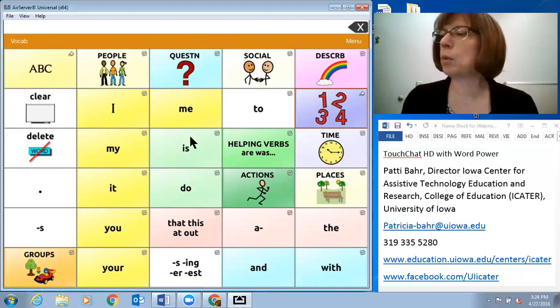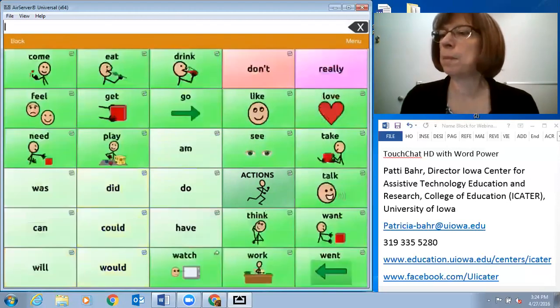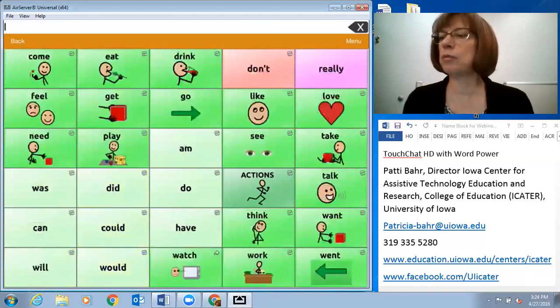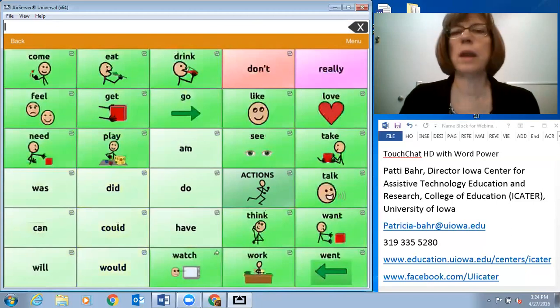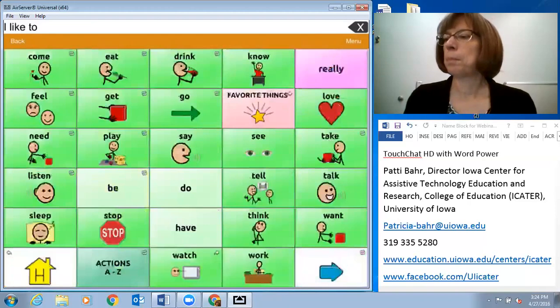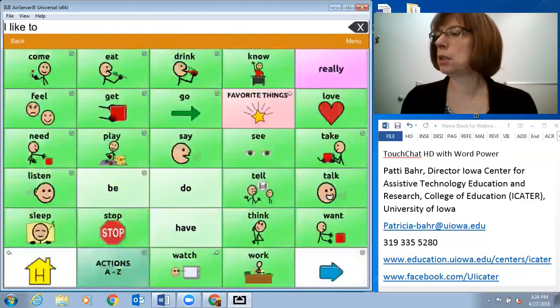So if, for example, I wanted to say I, it branches to probably a verb is going to be after I. So I was going to say I like, and here's like right here. To, I wanted to say look. I don't see look on there anywhere, do you?